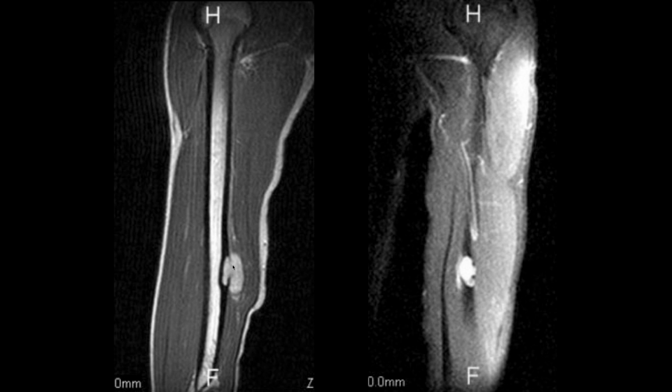Though my guess is, if it were cystic, it looks like there's some structure to this particular lesion. And on the T1 weighted images, it's not really low. So my guess is it's going to be a solid lesion, but it certainly does look like it has a lot of water content. Why would it be cystic, Leonard?